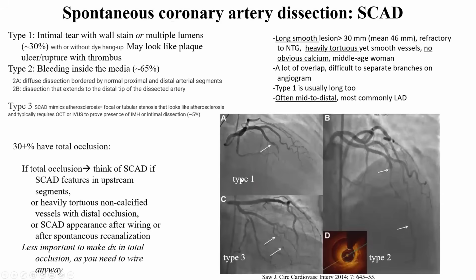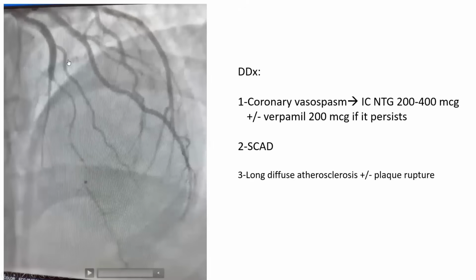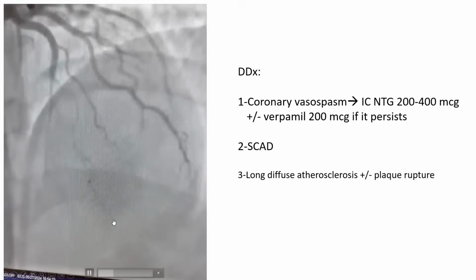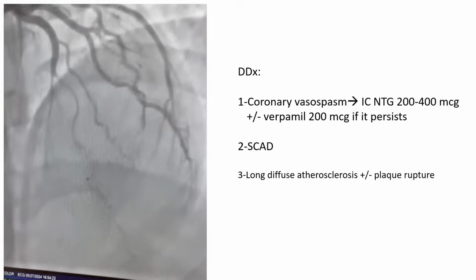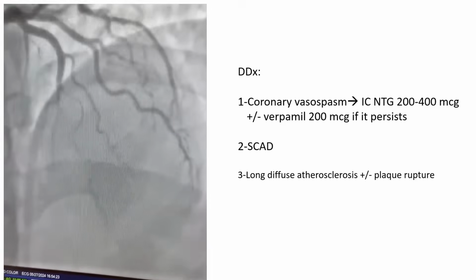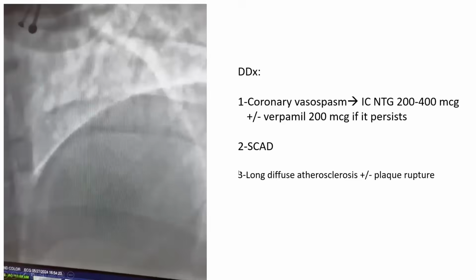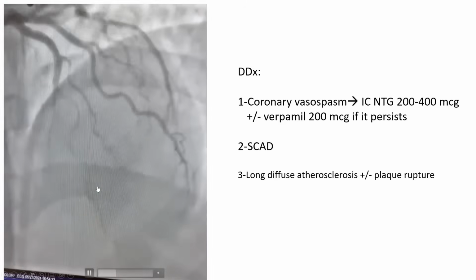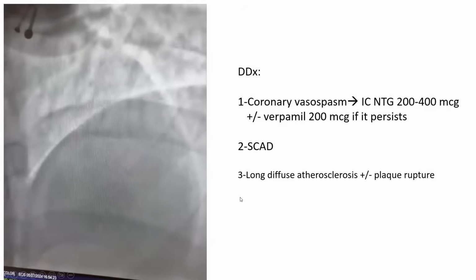So this is most likely SCAD, and you really need to recognize it because this patient has TIMI 2 to 3 flow, and she's not having an ongoing ST elevation infarct. Therefore, you should not touch it. You should not try to do PCI because there is a risk of PCI failure and complication of over 50% in those patients. And that's what my friend did here. So he did not intervene in this patient.